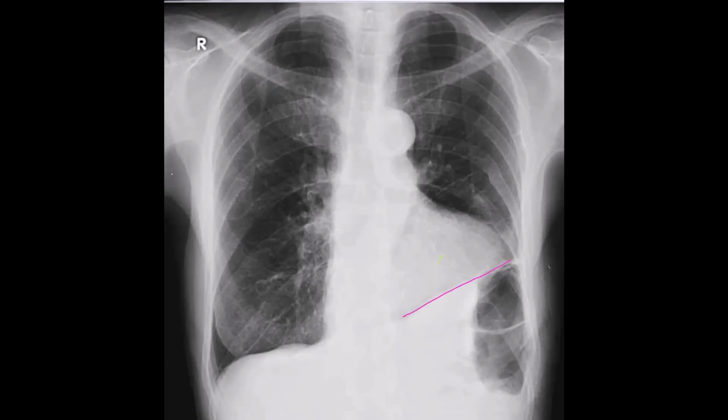So there is scarring of the left costophrenic angle due to previous infection or surgery of the hemithorax, and that is what is called ski slope appearance. Ski slope appearance of the costophrenic angle. And this is characteristic that this costophrenic angle has had an infection or inflammatory process.